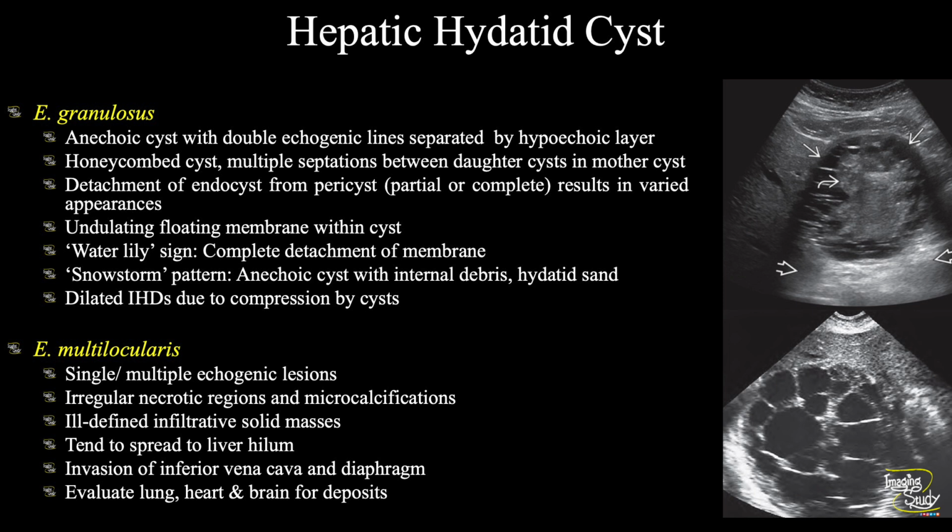There may be the snowstorm appearance when the anechoic cysts have internal debris, that is the hydatid sand within. If it compresses the adjacent bile ducts, then there will be bile duct dilatation.